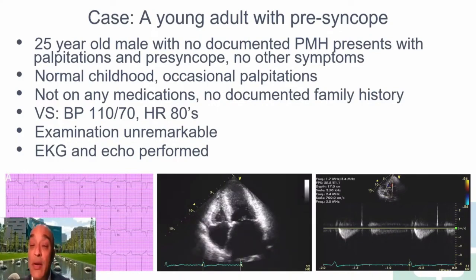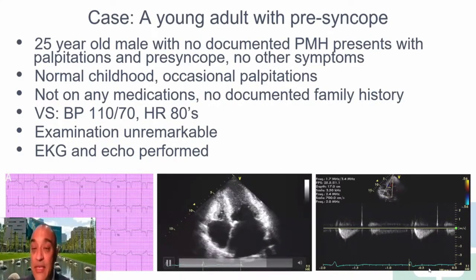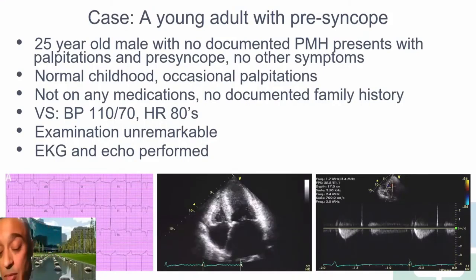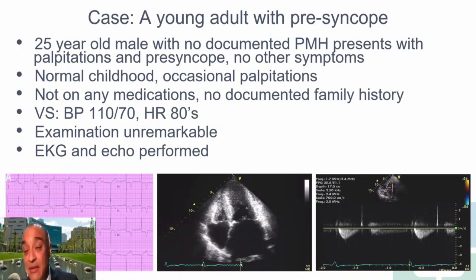And it is important, anytime you're dealing with an HCM patient, you go make sure they do not have an obstructive pattern. So we did provoke the patient, and he did not have any outflow tract obstruction.